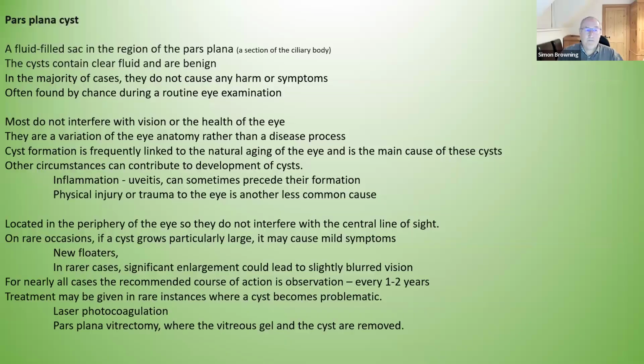Also common is a pars plana cyst. This is a fluid-filled sac in the region of the pars plana, so obviously a section of the ciliary body. The cysts contain clear fluid. Simon, did you say that's very common or not? Yes, they are common. Okay, brilliant. Thank you.